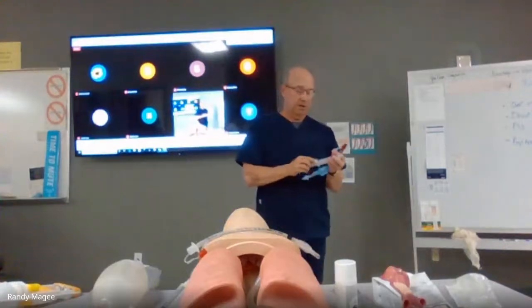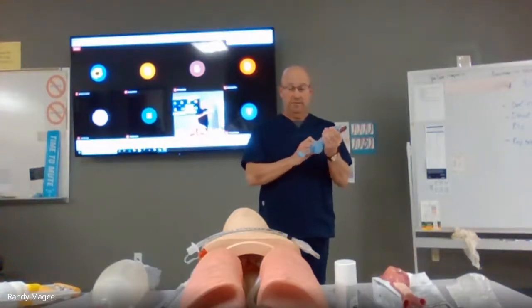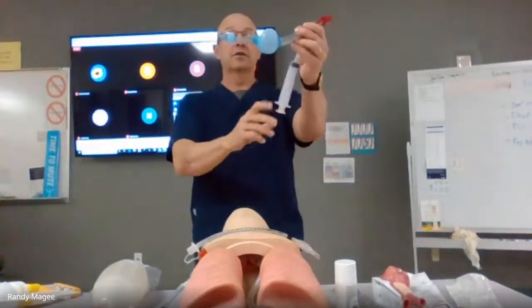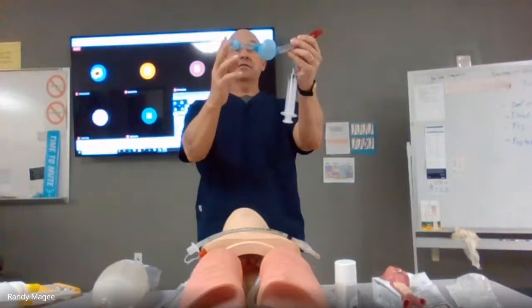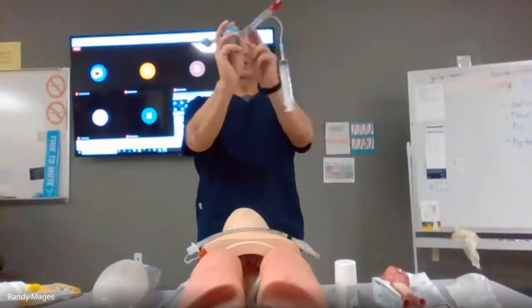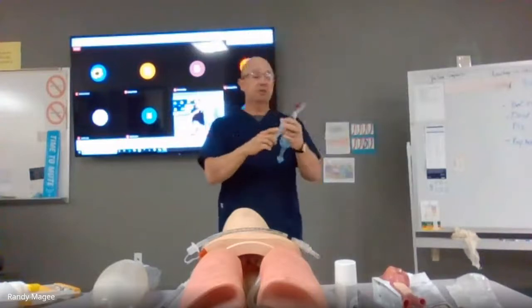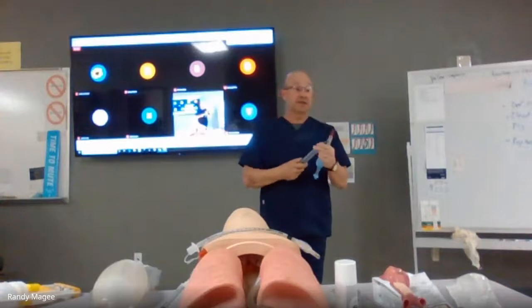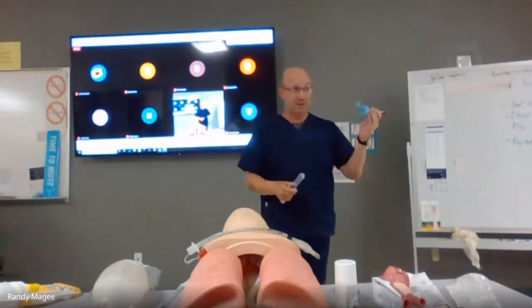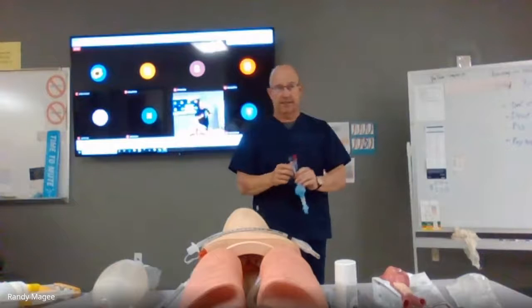A lot of EMS agencies are actually using this front line instead of intubation. And then you can sort of see how that looks there. So it's going to go in one place or the other. So if this goes into the trachea here, then this is going to block off the trachea, and it's still going to protect. Okay, so this is the one that's the most common. They're expensive. I've got one because it's expired. But it's definitely good for a rescue type of airway in case I can't get them, or a BLS.